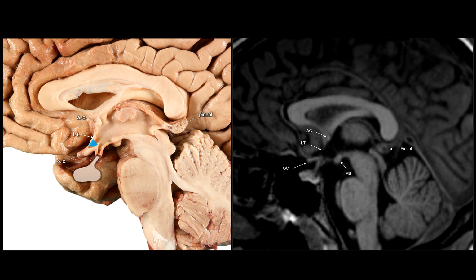You can see a small divot or recess above the optic chiasm, that's supraoptic recess, also known as chiasmatic recess, and another small divot that's an infundibular recess sitting on the infundibulum. And again, you can see that also fairly well on a sagittal T1 weighted sequence right there. If you draw a line between the mammillary body to the optic chiasm, that straight floor, that is tuber cinereum.